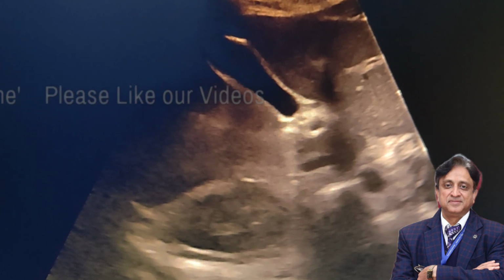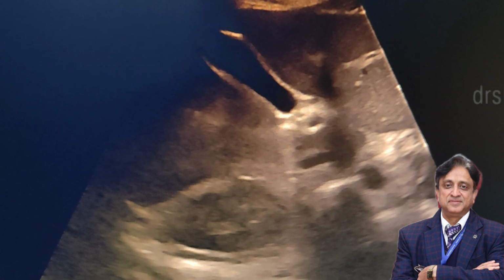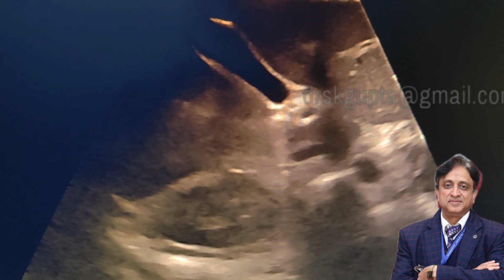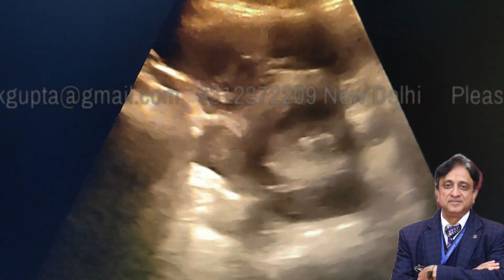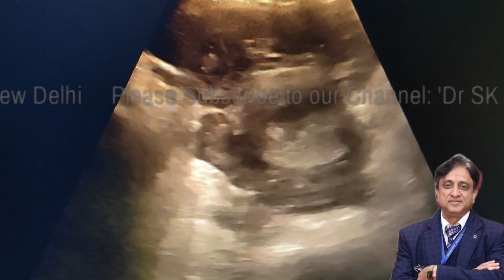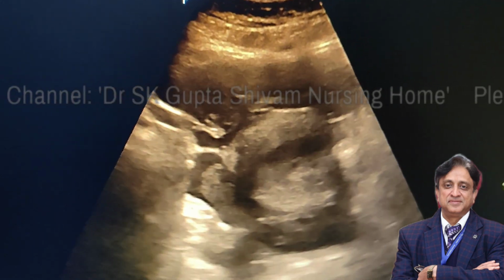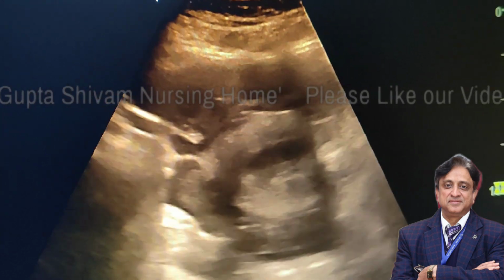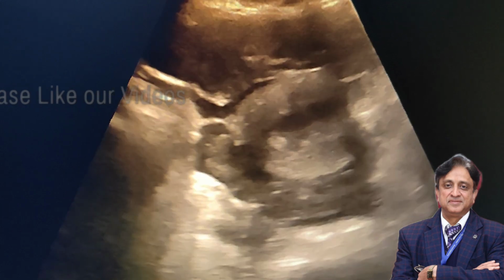Most of the times the ectopic pregnancies occur in the tube, and in about 5% of patients the ectopic pregnancy can be in the ovary also. But by doing the examination we cannot really find out whether it was an ectopic pregnancy which was present in the tube or it was present in the ovary. By doing the laparoscopy or laparotomy, we can find out where this pregnancy was, and such a surgery can be life-saving surgery for this patient.